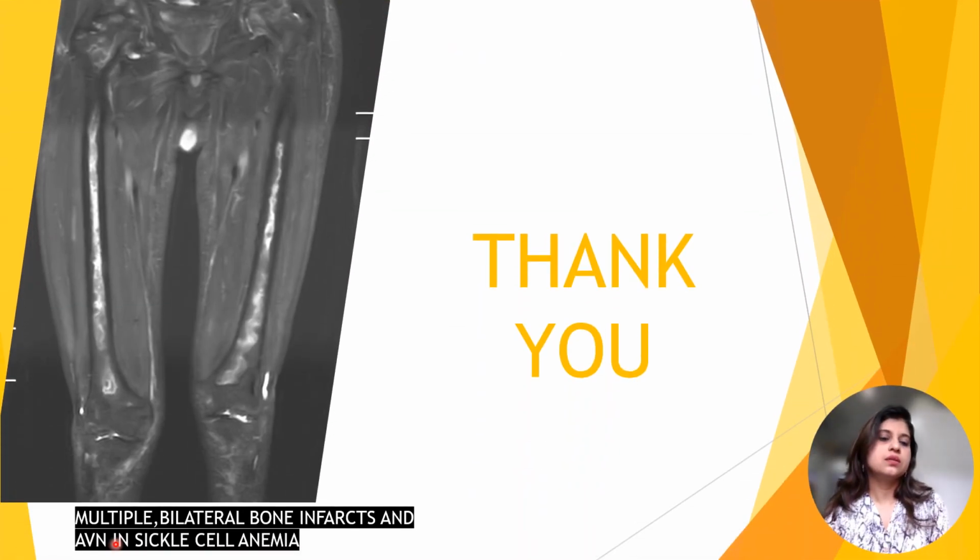This is the case of a sickle cell anemia patient who presented with multiple bone infarcts and AVN, that is, bone infarcts in the epiphysis are known as AVN.